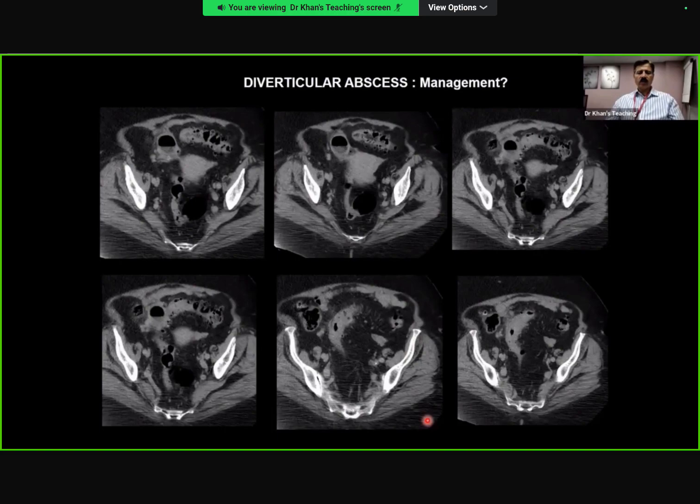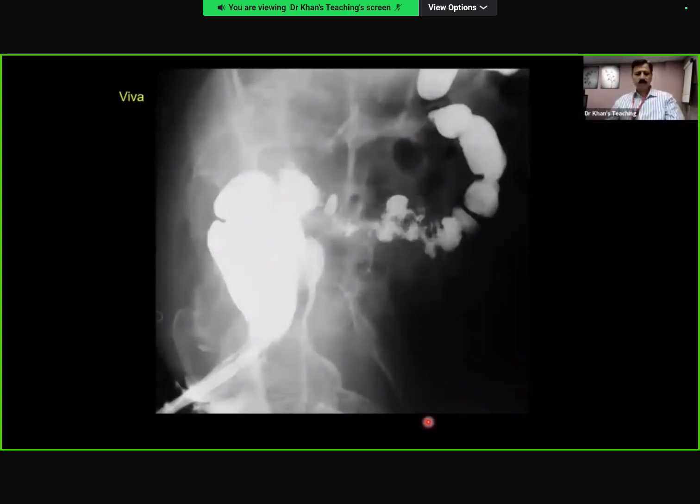But generally speaking, most of the surgeons think that up to 5 centimeters, they will be more happy to go for IR help. And in your viva, once you say that, then the examiner might ask you some questions about IR, which you have already covered. This is a very, very good exam film. Over to you.